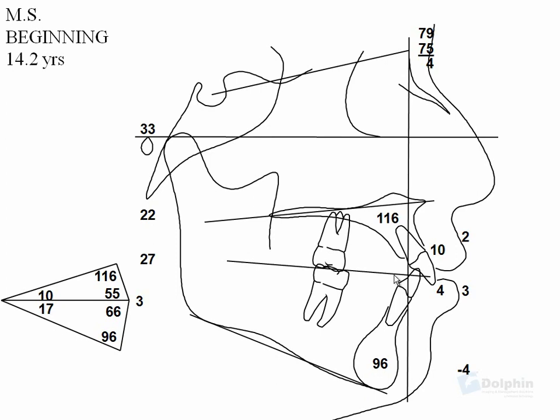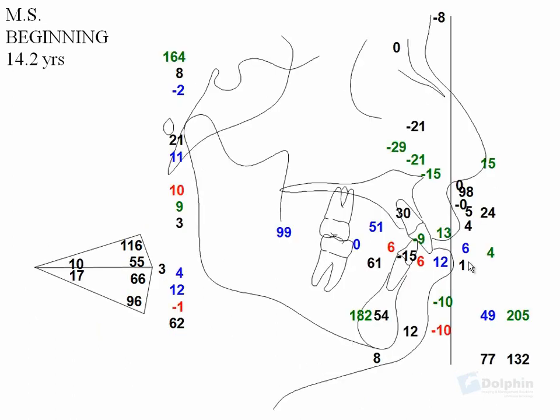This is his traditional cephalometric tracing, which is based on cranial base landmarks. This cephalometric provides us good skeletal and dental information. The next tracing is an excellent addition to the traditional cephalometrics. This is the Arnett analysis. This is based on natural head position with a patient looking into a mirror and a vertical line dropped through subnasale.